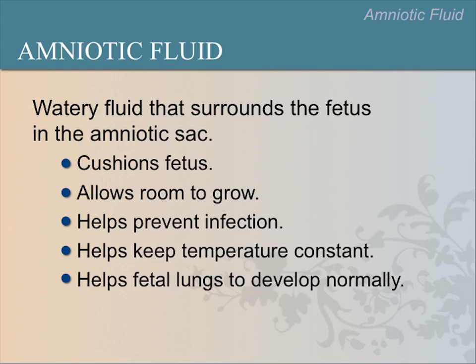What will amniotic fluid look like on ultrasound, and why? Please pause the video now to encourage responses from the group. Because it is fluid, it will appear black on ultrasound because it is anechoic.